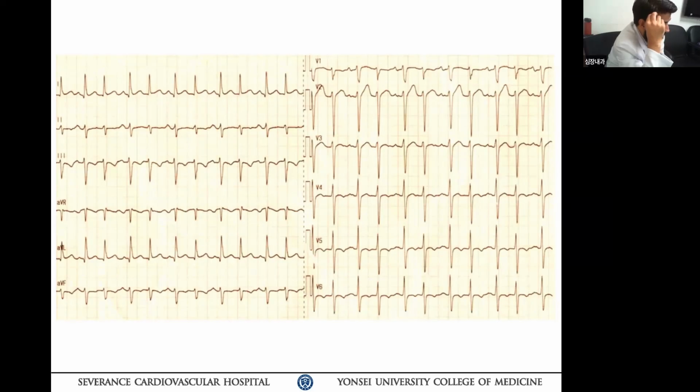When you look at the first QRS after the P wave, that one is broader, and the second one is narrower than the first. I don't know if it can be an example of gap phenomenon, where the slower conduction improves, so the first one, because it's broader, maybe has some degree of conduction system block. But if it is gap phenomenon, the second QRS should be conduction delay or block, don't you think so?